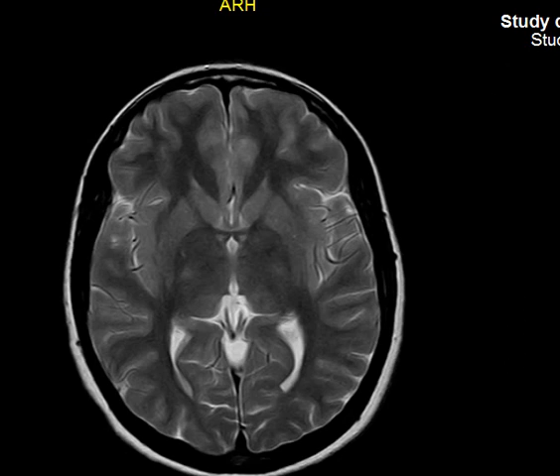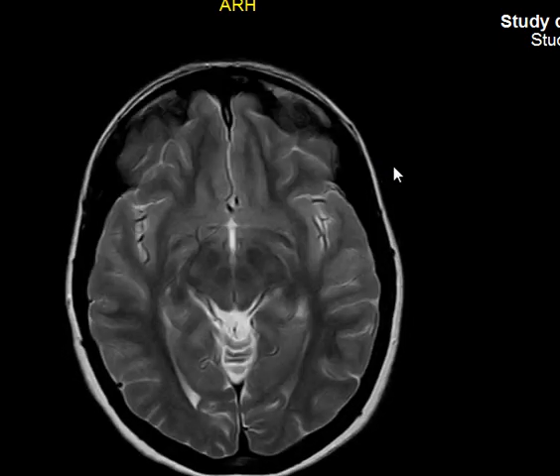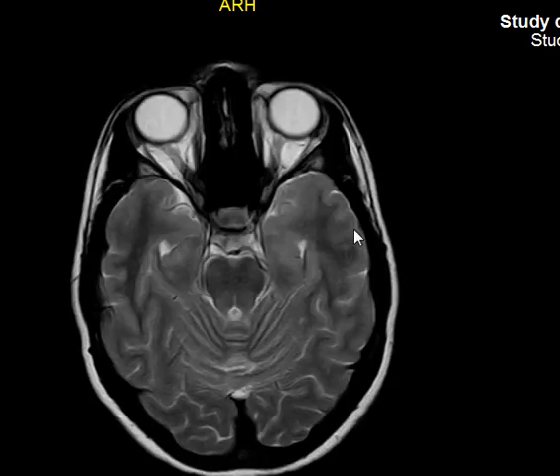Now, moving to the sagittal images, I think we need to address them also. Before we move to the sagittal, it's a good question. The cisterns are just like lakes, collections of CSF. We see them mostly at the skull base, at the base of the brain, below the brain. Sometimes when they are occluded they might also cause abnormalities, if you have a lesion there, if you have a tumor or whatever. Okay?